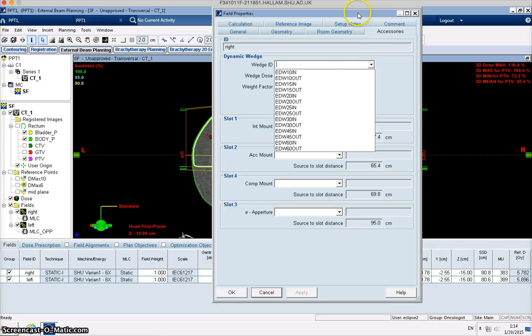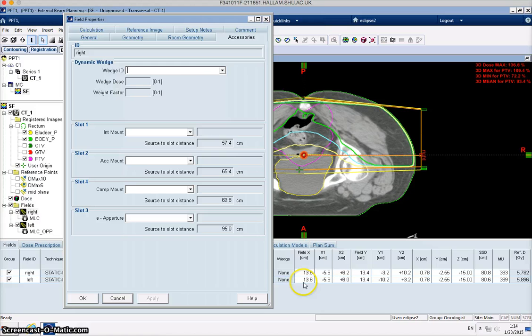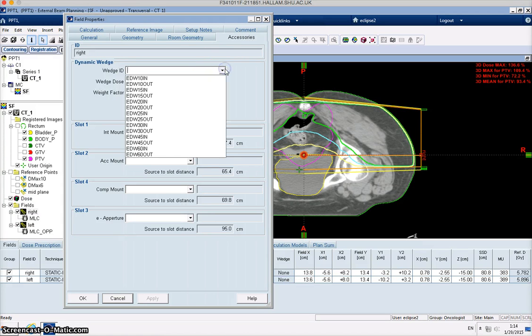And this is where, when I mentioned changing our collimator to 90, this is why we needed to do it to 90 degrees. So on a Varian machine, the direction of the wedge is controlled by the collimators and the direction of the Y jaw, so which way the Y jaw is moving, and it creates a wedge using an EDW, an electronic dynamic wedge. And so we need to have the Y jaws in the direction of ant to post, and that's why we have 90 degrees.